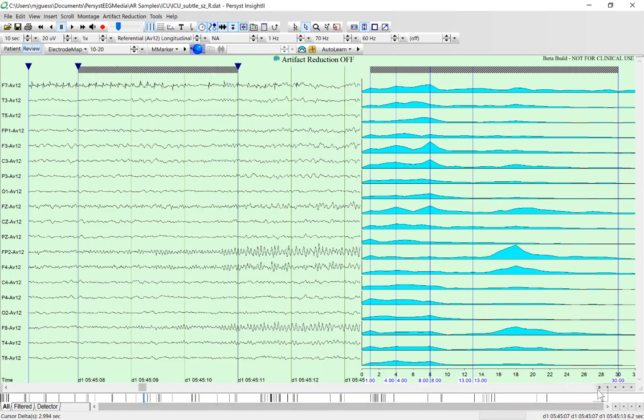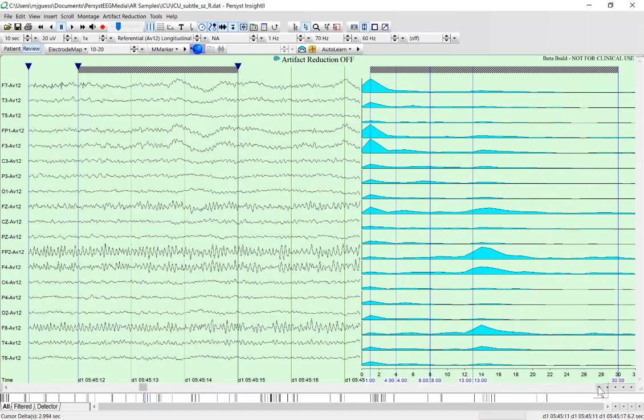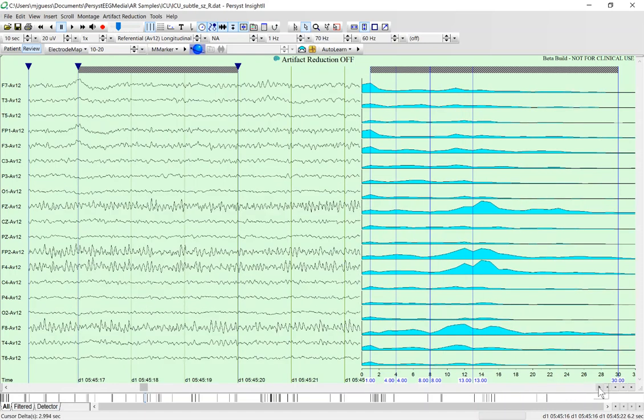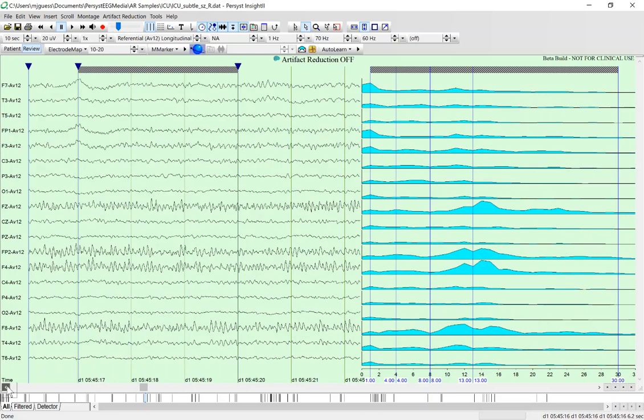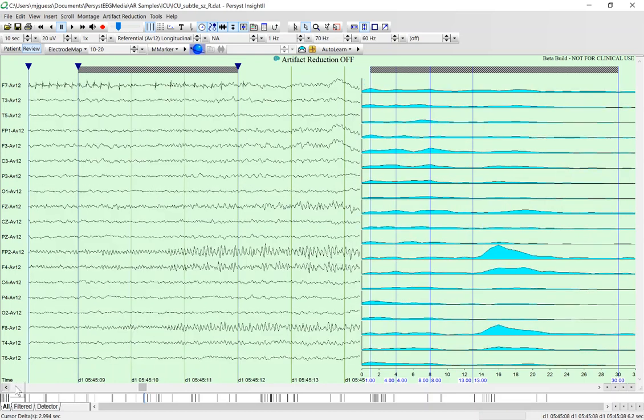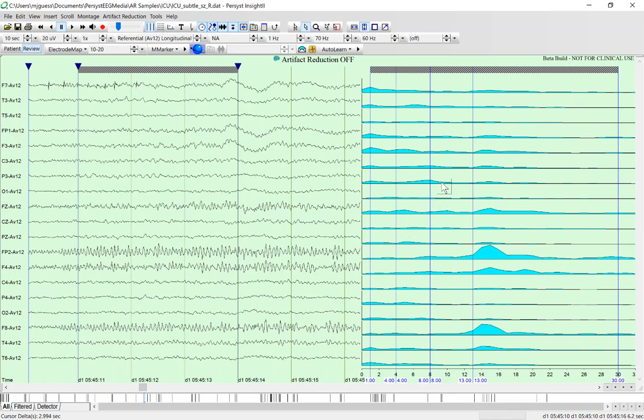And if I bump the EEG to the right, we'll see as the seizure evolves that the frequency bump here between 14 and 16 hertz is going to move downward as the seizure evolves. You can see that sliding downward in the range as the seizure evolves. Okay, so I'll go back to the onset, use that little single arrow there, and let's say I wanted to export some values from this.